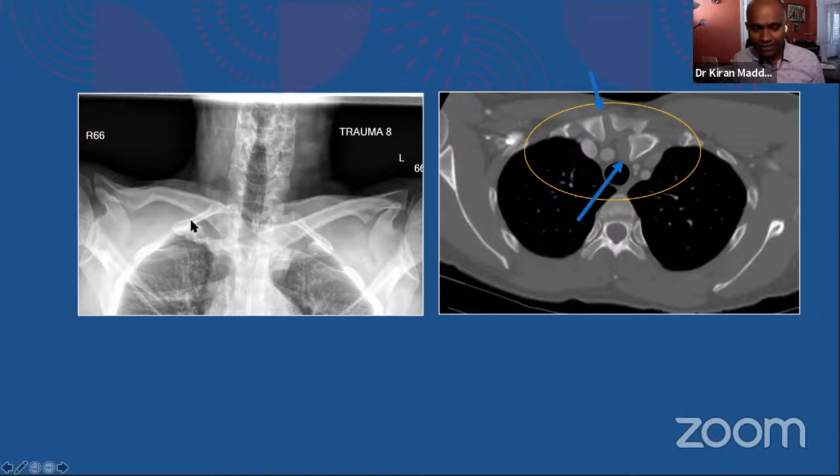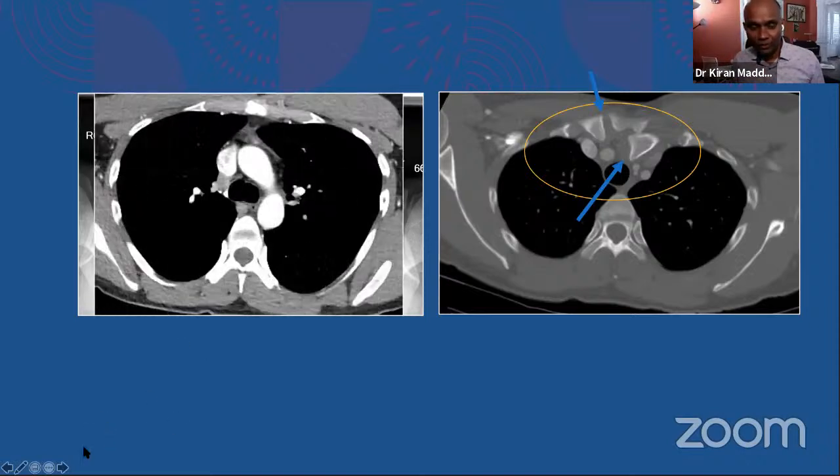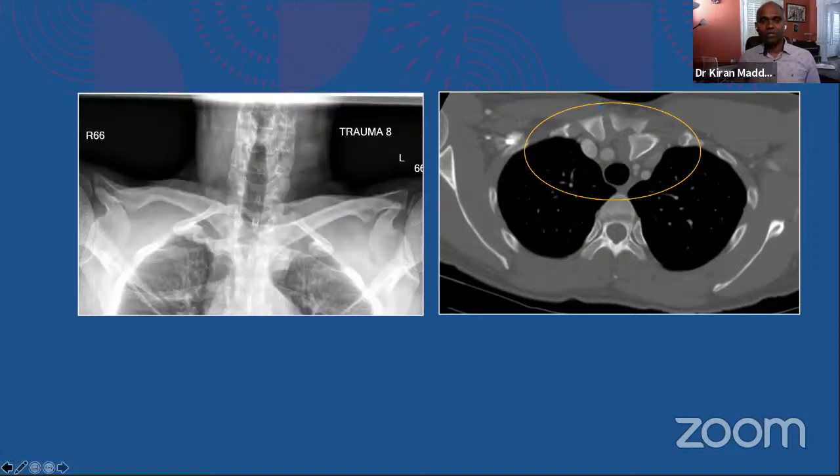If you are clinically suspecting this, sometimes sternoclavicular dislocations and acromioclavicular dislocations are better identified by residents than the radiologists. I'm not kidding. I'm not trying to impress you here. I'm telling the fact, because this is a very rare location, and unless you examine the patient clinically, you will not know where exactly the site of injury is.